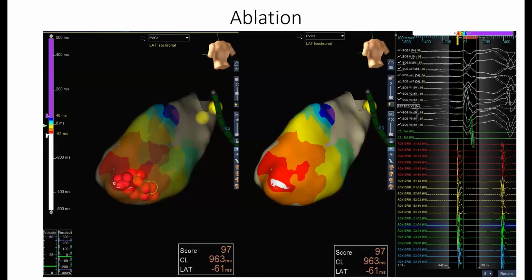Point the arrow so everybody can share this, because it's important. That one, and just a small tiny spot right above it. You're supposed to go up a little bit higher, come higher, not that one, keep coming. Yeah, that guy. He's also present in your other map.